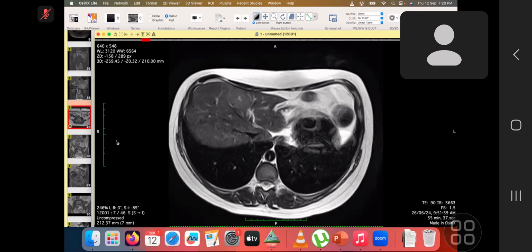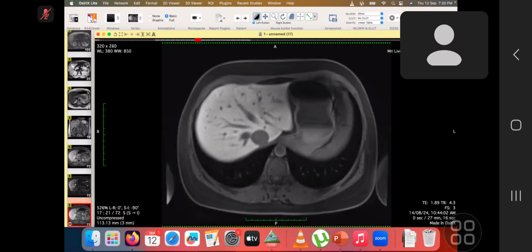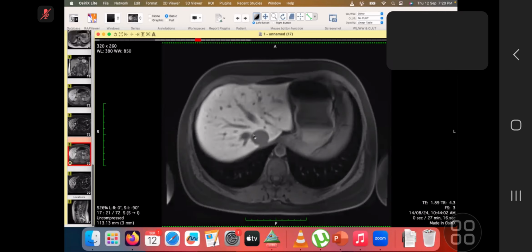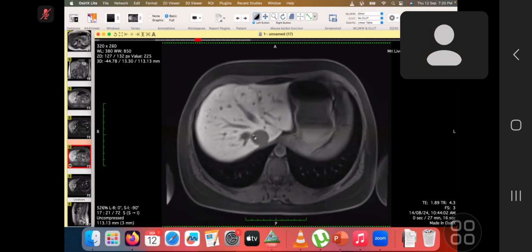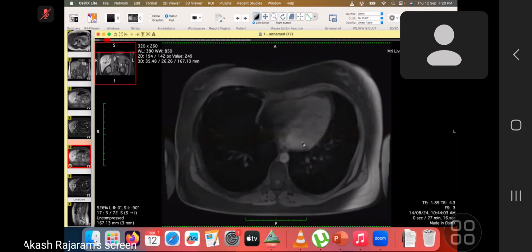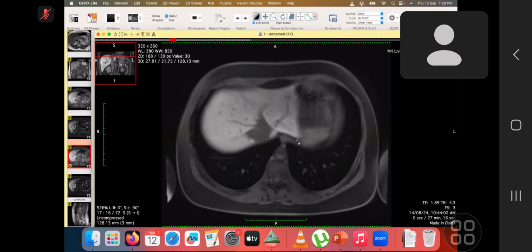Let me show it to you, hepatobiliary. Yes, doctor, sorry. Yeah, just let me show it to you. Mhm. Yeah, you can go ahead and scroll. Yes. So scrolling, one moment, I can't scroll. Okay, so I'm reviewing the hepatobiliary phase.